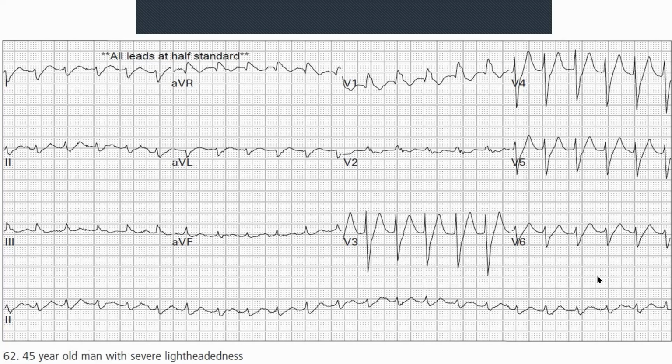And there tends to be what we call concordance. Now, concordance means that you've got all of them facing in the same direction. Whereas in this one here, we can see there's something called discordance, where we've got some pointing in one direction, some pointing in another direction, and so on and so forth. So that's just two of the differentiators.